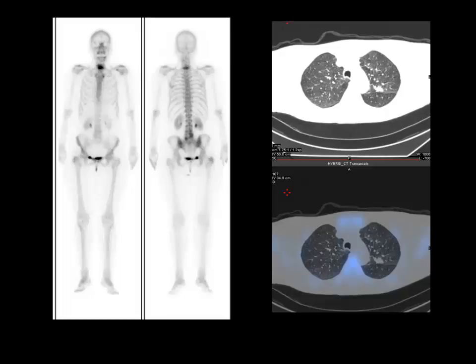And the other thing is, as imaging physicians, when you have data, legally you have to look at everything which is available to you. If you don't, then you are legally liable for missing a lesion. So although this patient had SPECT CT, you have to look at the soft tissue, you have to look at the lung windows, and you have to look at whatever windows are available.